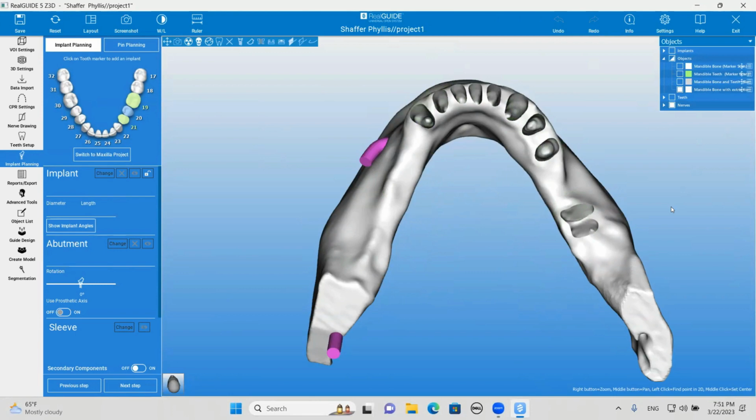Yes, this is a 68 year old female. After I was analyzing the CBCT scan, I asked more about her medical history, and she said she's taking Fosamax. Okay. Do you know how long she's been taking Fosamax? Yes, I asked that question, and it's been 3 years, since December 2019. Okay, so we're looking at 3 going on 4 years.